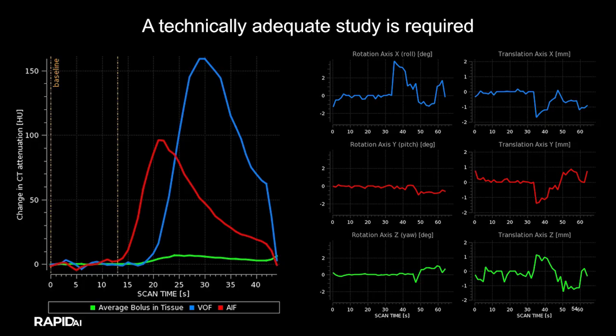And what that means is that we didn't start scanning this patient. We started scanning this patient with a radiation for about 13 seconds before that contrast arrived. And we'd rather not do that. We'd rather just scan for a few seconds before the contrast arrives.